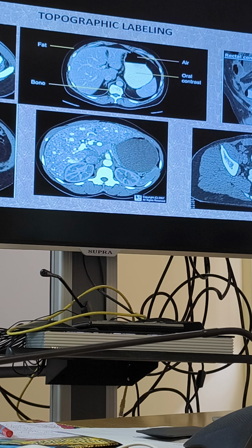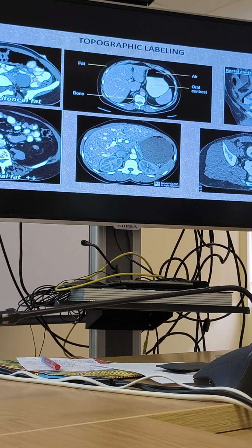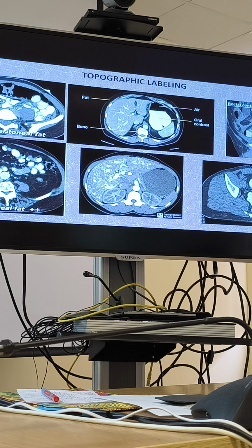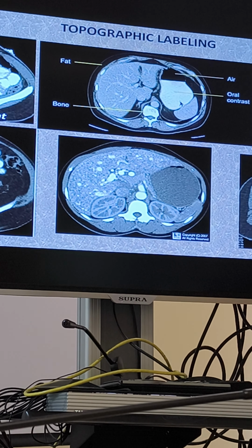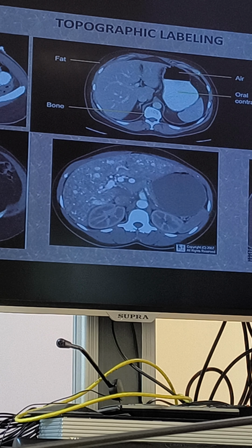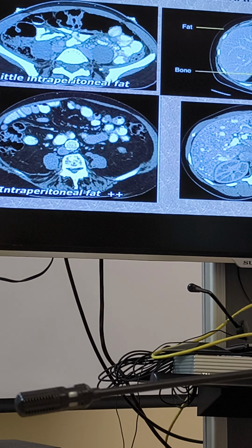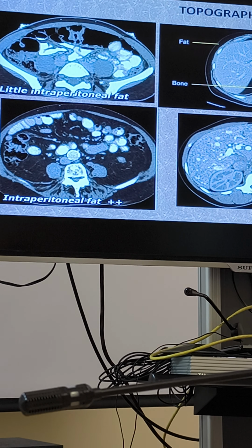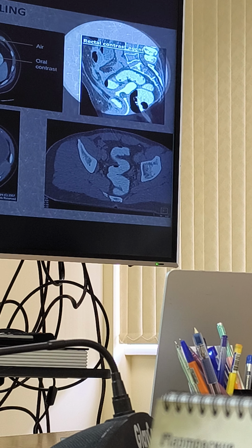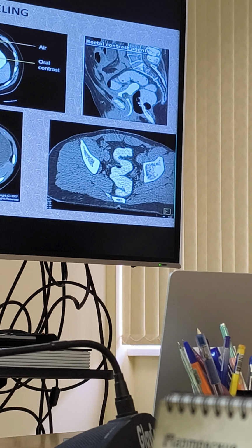In traditional X-ray, we are contrasting the gastrointestinal tract to look at this tube and to study it using contrast media. It will be brightly white, and we can differentiate it from surrounding tissue. On this picture, the intestines are brightly white, and that's why we can differentiate them from surrounding tissues. In this picture, the rectum is bright. The rectum is bright, and so this is again the way to differentiate it from surrounding tissue.